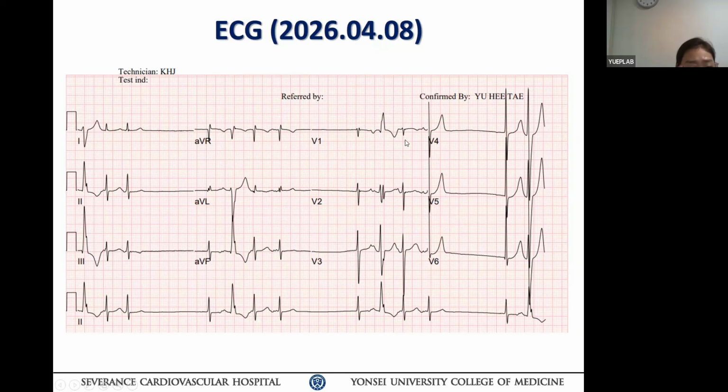Because junctional rhythm is mostly narrow QRS, but the activation sequence is a little different from the sinus AV node conducted QRS. It's probably overlapping with the P wave and T wave, so I don't know which portion is the P wave. Anyway, the P wave generated a wide QRS because of the bundle branch block. Dr. Washington mentioned it, the Ashman phenomenon.